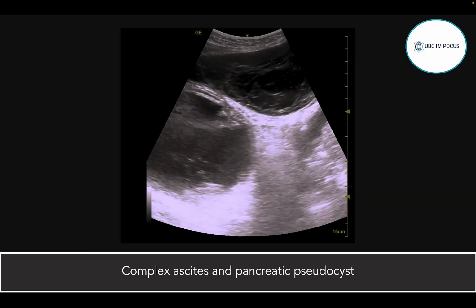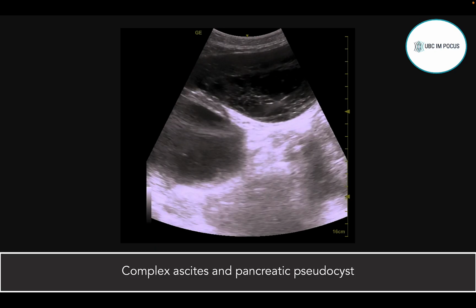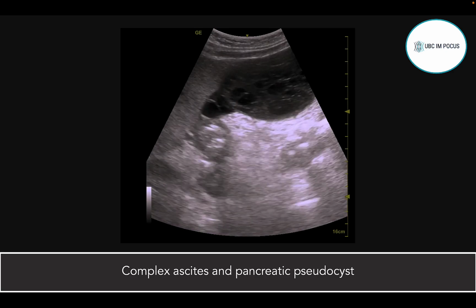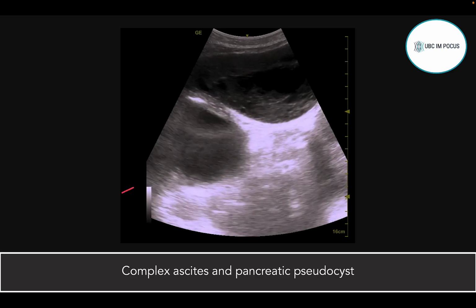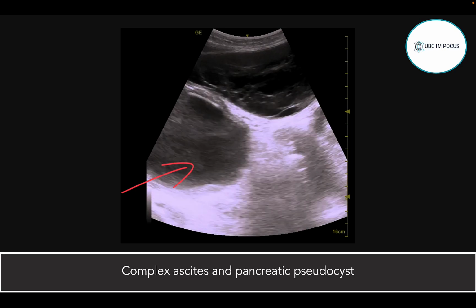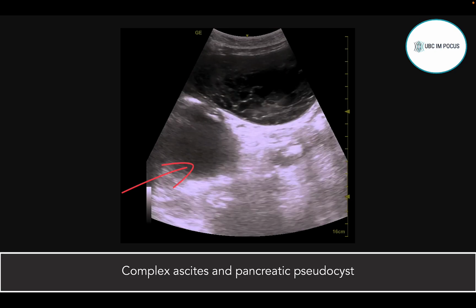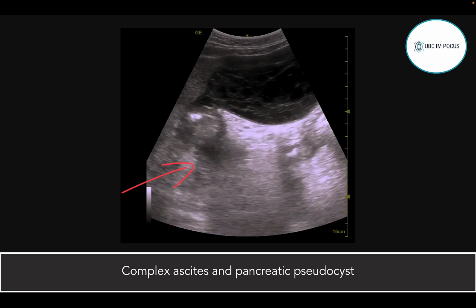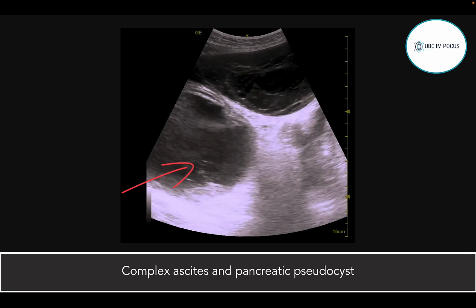This is an interesting example. I'm not sure what side we're on because we're not labeled, but it looks as though there's some intra-abdominal organ on screen left there. And we see two black areas, anechoic or hypoechoic areas. One that's deeper here looks very rounded, that I would say is certainly not free fluid. Knowing this case, I can tell you it's a pancreatic pseudocyst, but if I didn't know that, I would just say it's some sort of fluid-filled cystic or potentially even an aneurysm, some sort of collection filled with dark anechoic fluid.